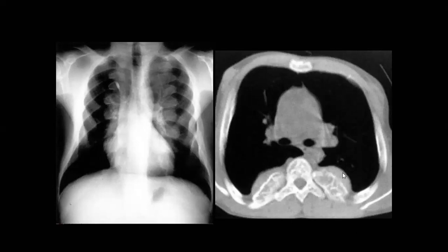What is this soft tissue called? Yeah, paraspinal soft tissue. Extramedullary hematopoiesis. They like it in the exam, and this one is a bit easy. Sometimes it can come to you with just one side more prominent, and you will talk about a mass.